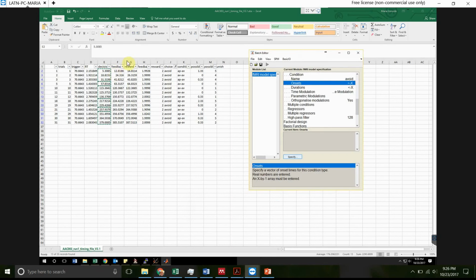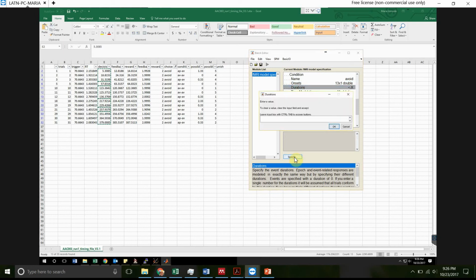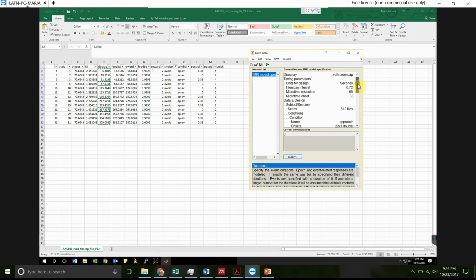Onset times. I paste them in there. Durations, again, these are fast stimuli that aren't turned on or off for more than a few seconds. And so there are 2 conditions that we would want to. Now, there are obviously other conditions in this task, but for simplicity's sake, these are the 2. And so you can see that's how you would put them in.